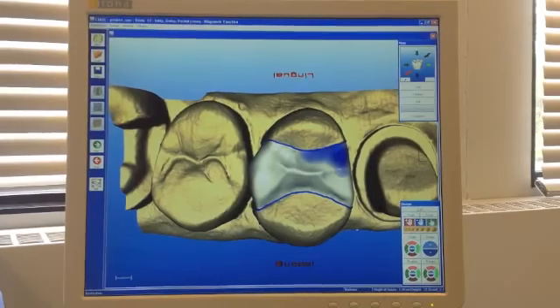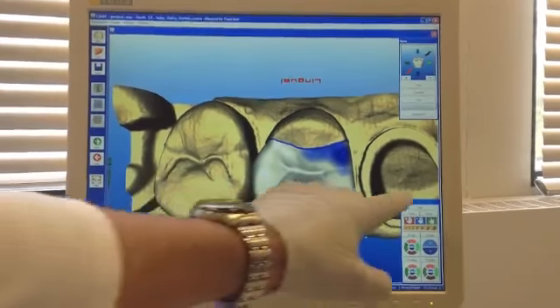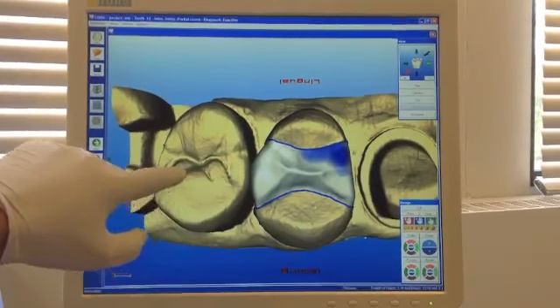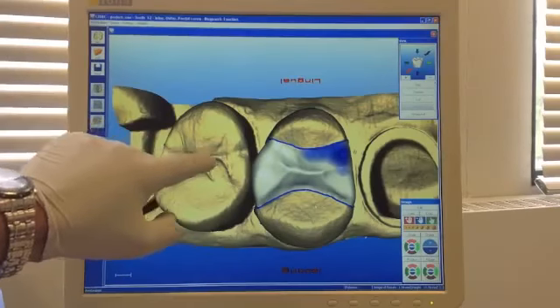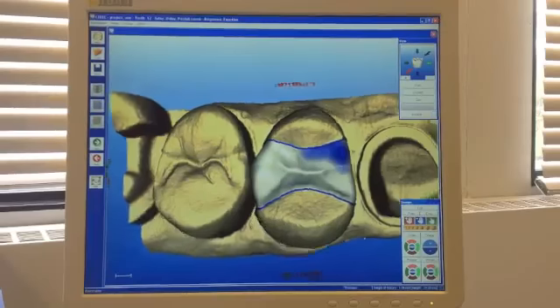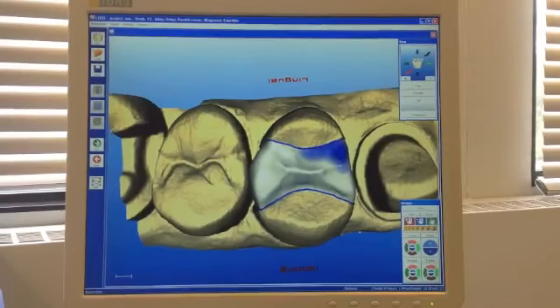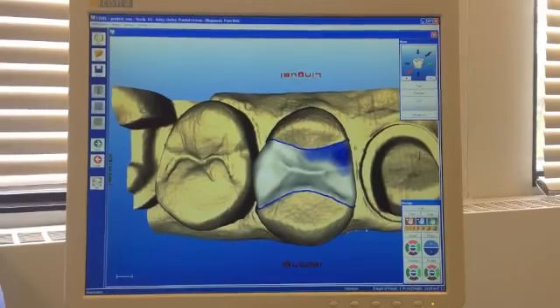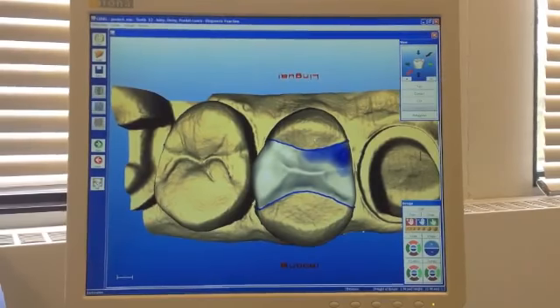The software is also taking information from the adjacent teeth. In this case here we have a crown. Here is not really useful, but the adjacent distal tooth is another bicuspid and can provide information about the occlusal surface for this restoration. There is also the proximal distal contact, and the software is also adjusting the distal contact in order to get proper occlusal and proximal contact areas.